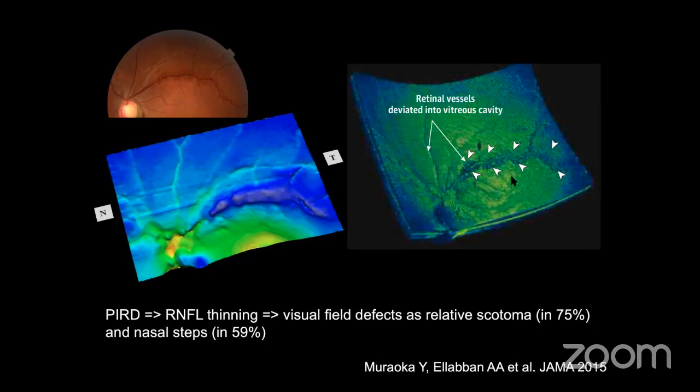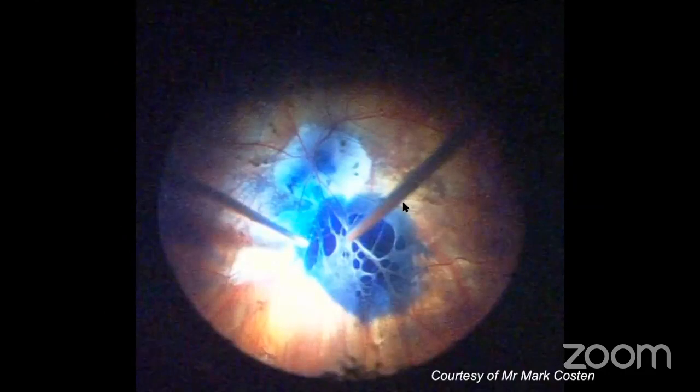And this change is mainly due to the difference in elasticity of the ocular layers. It seems like the inner retina is less elastic compared to the outer ocular layers. And it's a very similar change which you may come across during some surgery for highly myopic patients. Like in these cases, we can see very obvious paravascular inner retinal defects, like in this case.